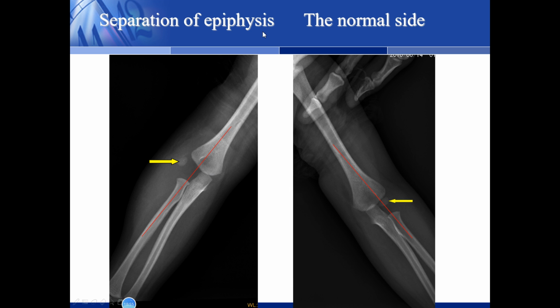Separation of the epiphysis. Here is the epiphysis, and the epiphysis is displaced. So we make a diagnosis of separation of the epiphysis.